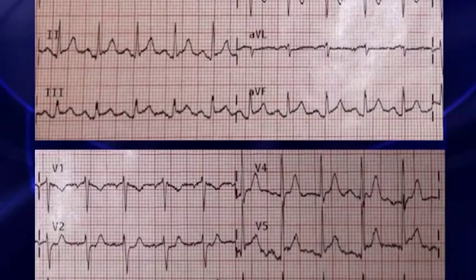So, step number 1, we're going to ignore AVR and we're going to ignore lead V1. Is there any ST segment depression in any of the other 10 leads? If there is, you've got to call this a STEMI. Nothing may be 100%, but it's pretty darn good. Now, I would say that if you look carefully, you might see some ST segment depression in lead AVL and maybe in V2 also. Some of you might say that's a soft call, maybe in V3 as well.